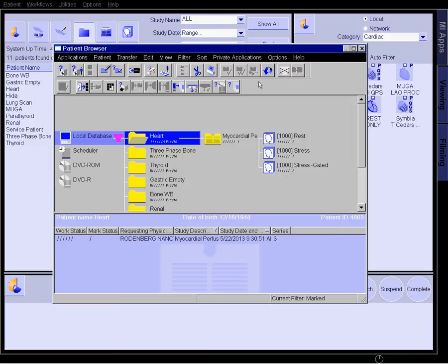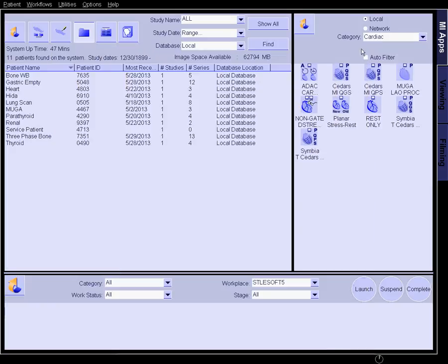It's just a totally different program that bridges all three of these together. So we'll worry about the patient browser later. Patient browser can be accessed, just for your own information, from the patient button or from clicking this button here. And if you ever have a question about anything, just hover your mouse over it and it'll tell you what each thing does.